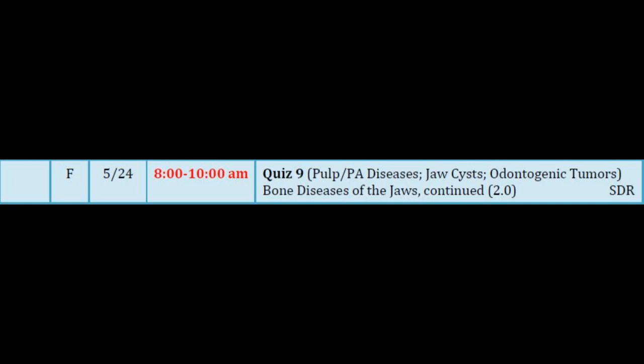Describe this. Is the lesion lucent, opaque, or mixed? Is it well-defined or ill-defined? It's well-defined, and it has a radiolucent rim and a sclerotic border. Did you notice all of that? Did you notice its relationship to normal structures? It obscures the root apex of tooth number 19.